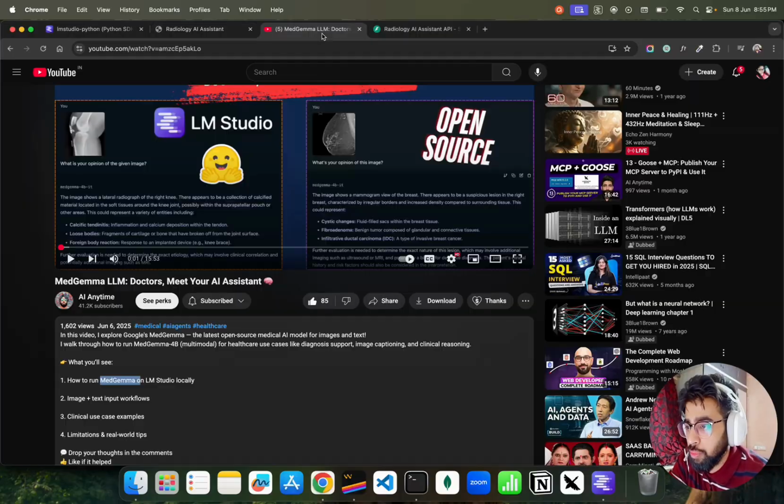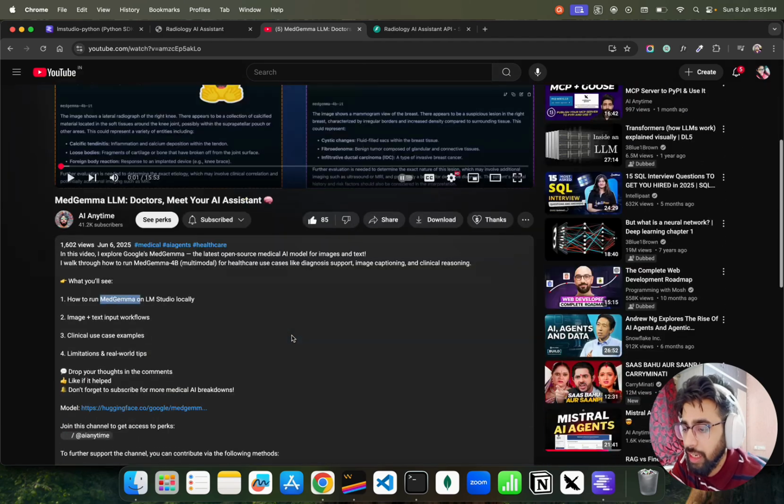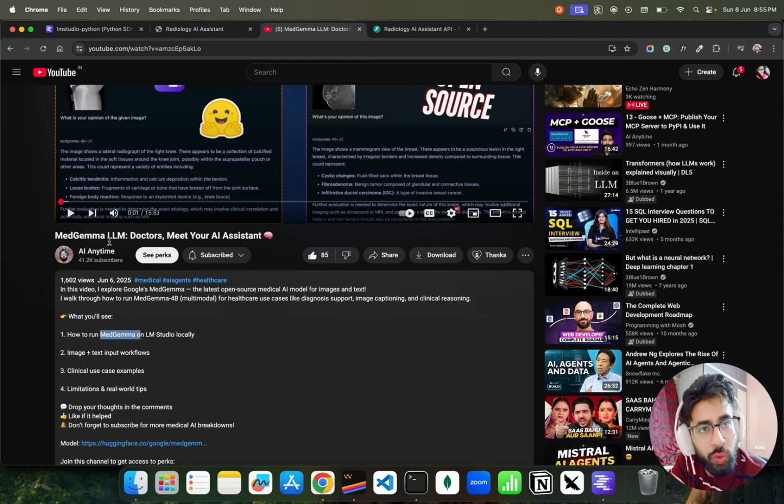In this video, I'm going to show you how we are extending the medical LLM project that we started in the previous video. Let me share my screen. Okay, you can see it here, right? We were talking about MedGemma LLM, Doctors Meet Your AI Assistant. That was the title of the video, right? Now, MedGemma is a Google model, which is a medical LLM, or rather a medical VLM. It's a multimodal model, so it understands media files, images, frames, and whatnot, right?